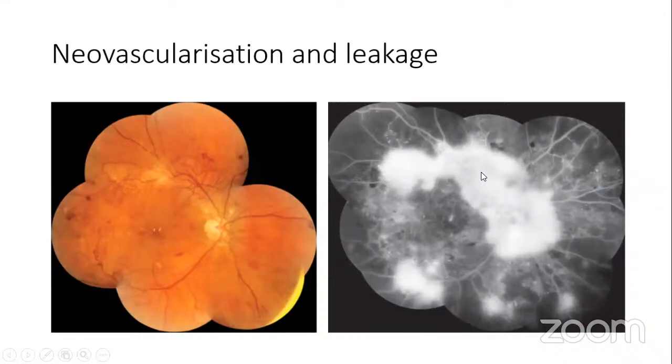So apart from giving abnormal hyperfluorescence, the dyes are no longer within the intravascular spaces. They are outside. So you have extravasation of dye, a pool of dye that has stained the tissue. So when it says the neovascular vessels are fragile, they leak easily, this is a leak. Okay, down here too.